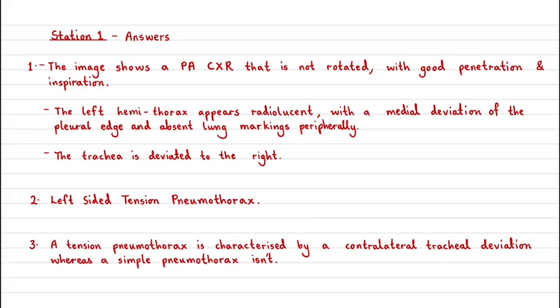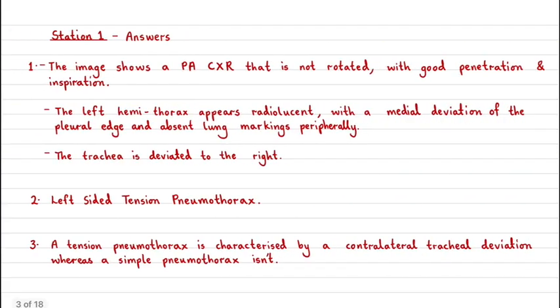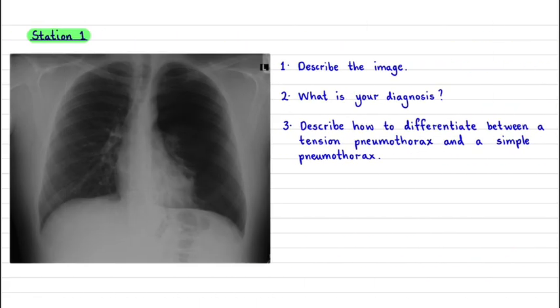So this is clearly a collapsed lung, meaning the diagnosis is a left-sided tension pneumothorax.